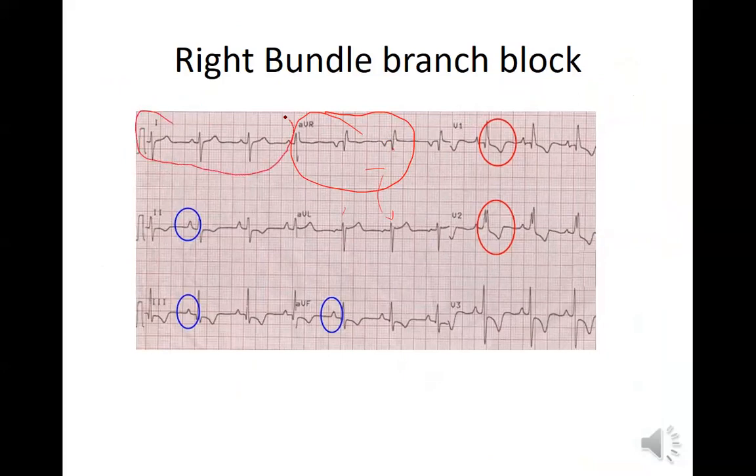Now this is lead 1. Is that positive or negative? Negative. And this one here, let's look at this beat in AVF. So we have negative lead 1, positive lead AVF. Is that right rotation or axis deviation? Right axis deviation, because that's a limb lead. Very good. I almost missed that one. I probably miss it every time.